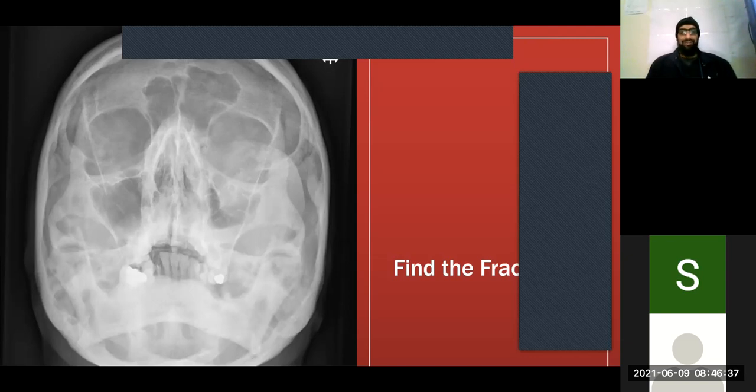So let's try the simple ones. Okay. So let's look at the simple line. All right. We just go straight across. Do we notice anything? Not really. Agreed. What do we see here? Let's come across to line 2. Do we see anything? Not really. Agreed. Kind of looks normal over there. Let's look at line 3, which is sort of going through there. Do we see anything? Not really.